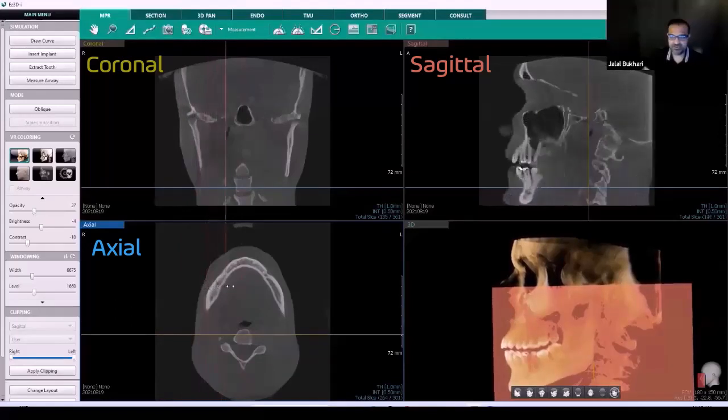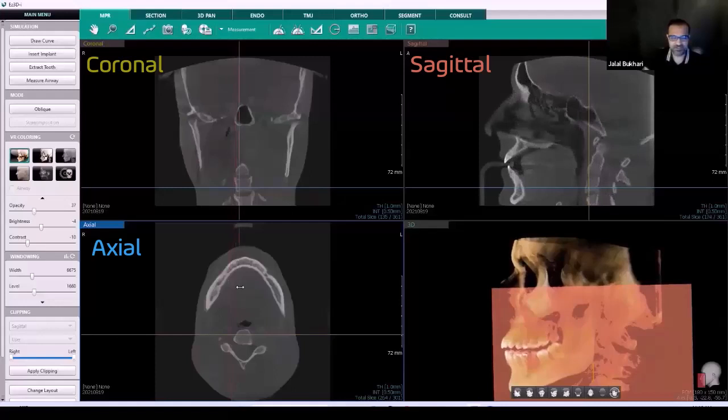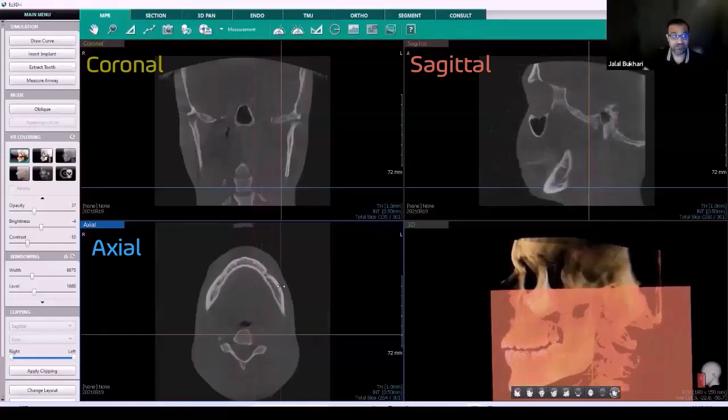And like you see right here, we can only scroll through one side. So we only see one side of the osseous structures, and it's not a comparison like you can do in the coronal and axials, where you have structures on both sides and you can evaluate symmetry. But later on, I will tell you some of what I believe to be the beneficial views in the sagittal sections.